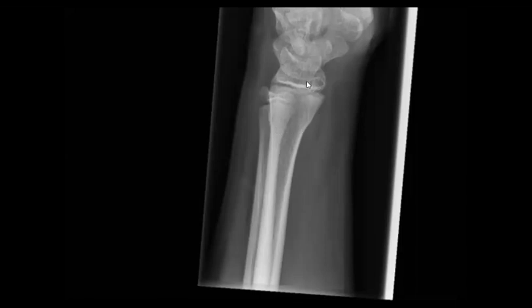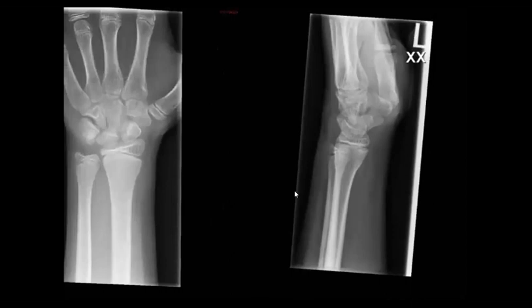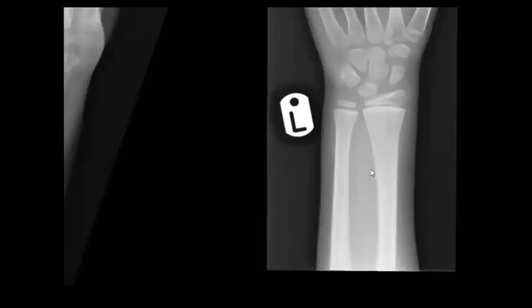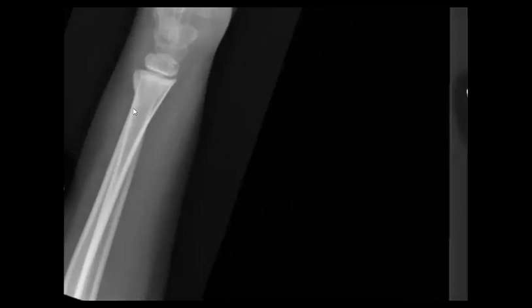So this one, pediatric age group. When you go to check the alignment, yeah, buckling, and this is what is called torus fracture. So torus fracture again, maybe very subtle, you can see it more easily in the lateral view.